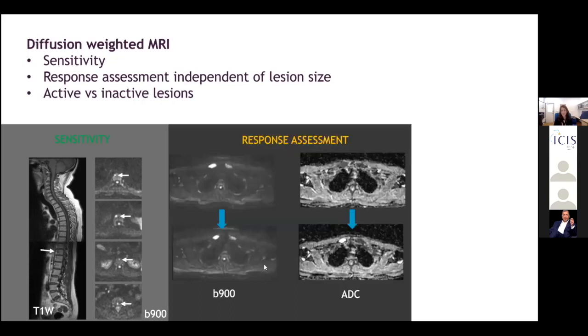I'm just going to touch briefly on response assessment because this is where diffusion really does come into its own. If you look at this lesion in the medial clavicle, you'll see that it reduces in size marginally, but the true insight comes from the ADC. So it starts off impeded, but then returns an ADC equivalent to fluid. So it's a completely treated acellular bone defect, despite the fact that the lesion hasn't disappeared.